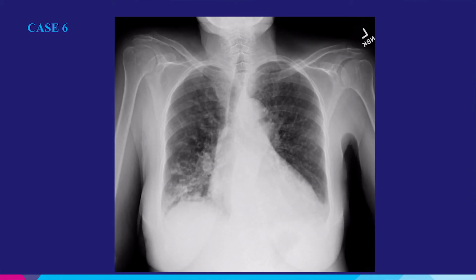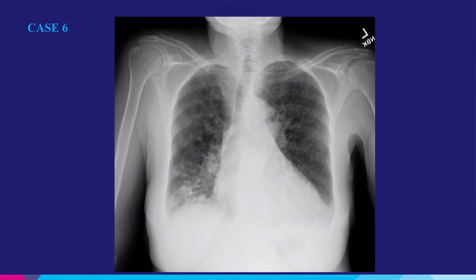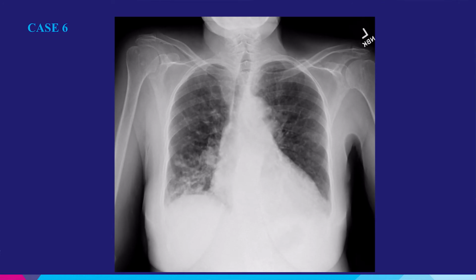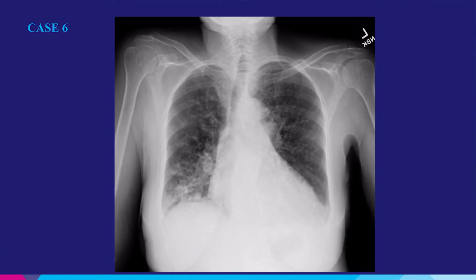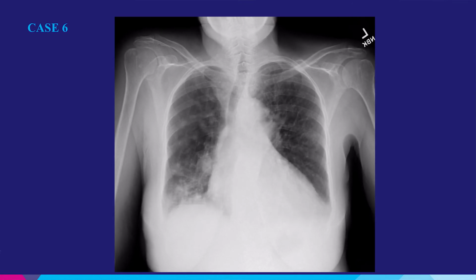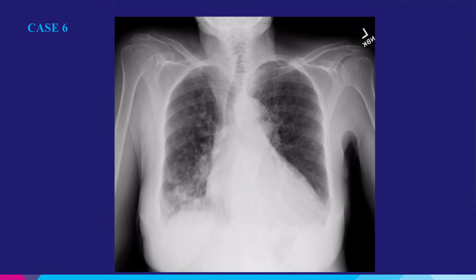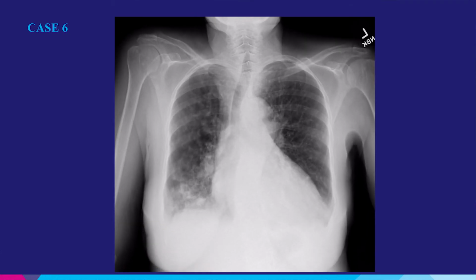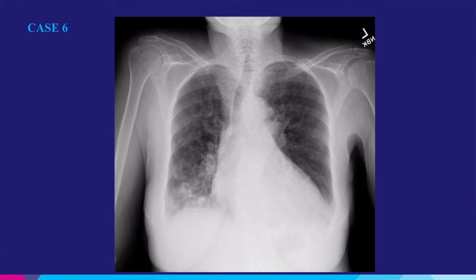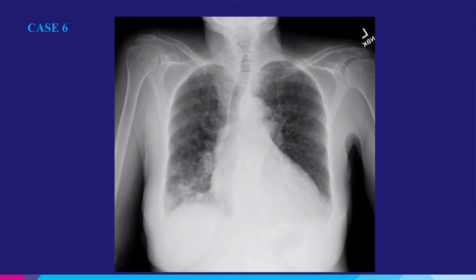If you go back to dynamic, we also could potentially get the diagnosis of COPD here. You can see increased work of breathing here, and the patient has to actually forcefully move the diaphragm for breathing. And then you see the pattern of obstruction and hyperinflation of the lungs, and the lungs are basically in expiration, not deflating well. So you actually get a sense of COPD.